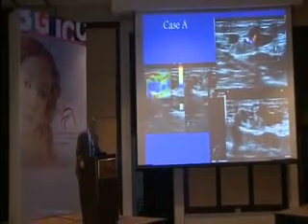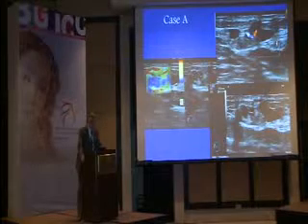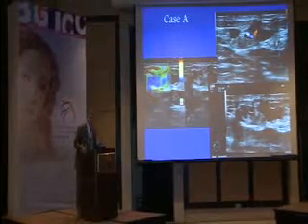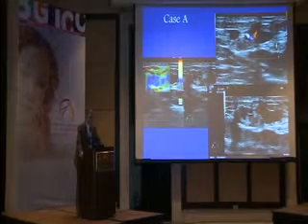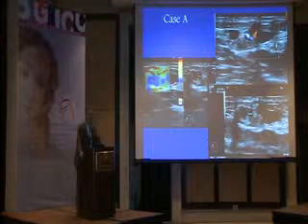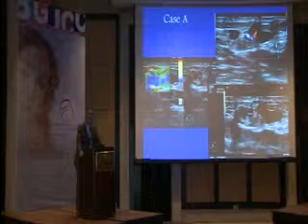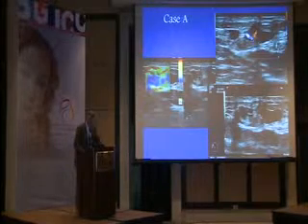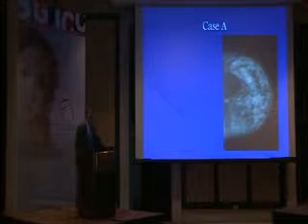This is the ultrasound of the same case. You can see here it's a mixed solid with cystic component, and this solid component has some high vascularity, and with the elastography it's more toward being hard. So this is the ultrasound picture. And this is the CC of our case.